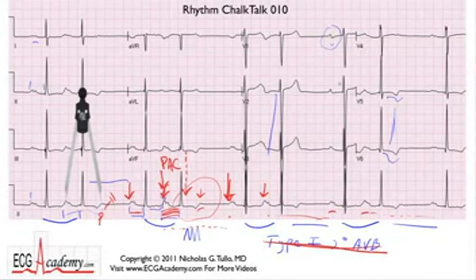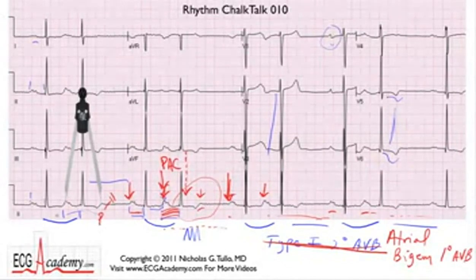What do we call the pattern when an ectopic beat occurs every other? It's bigeminy. I think we've seen this before. This is atrial bigeminy with a first-degree AV block, but there's no second-degree AV block here. All the P waves conduct. What you have is a first-degree AV block, but the bigeminal pattern makes you think that it's Wenckebach 3-2, but it's not. It's a common mistake that people make, and I wanted you guys to see this. We had seen atrial bigeminy in the past that was non-conducted, but these all conduct, and it gives the appearance of a second-degree AV block, but it's not.